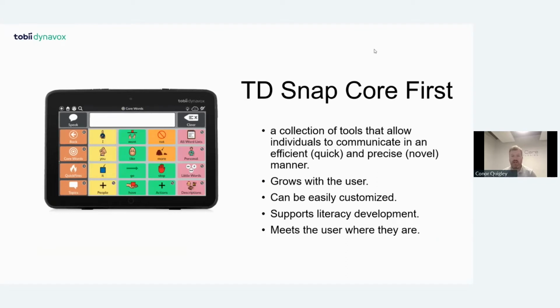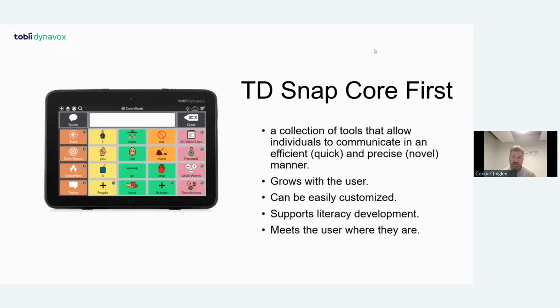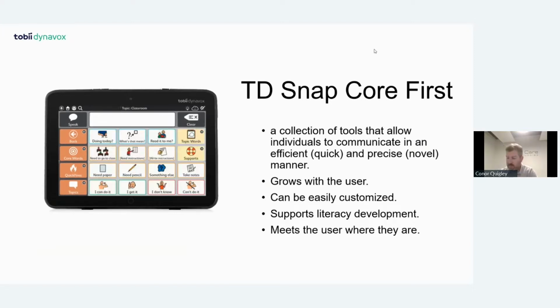We're not specific to any page set with a number of cells on a page. If we have somebody that can only use 2 cells, that's okay, right up to 80 words on a page and anything in between. We're not governed by having to use 20, 30, 40, whatever it may be. We can choose where the user's at, and we can set up the system to suit.